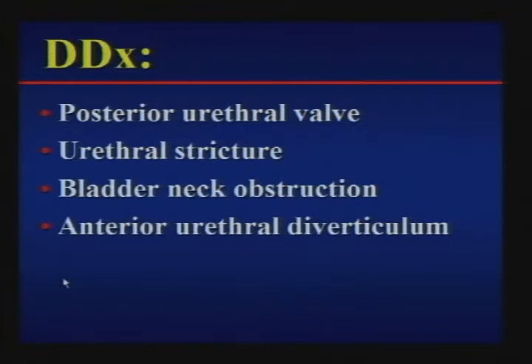What's on the differential? Well, hopefully they'll show you a nice example of posterior urethral valve. Urethral stricture doesn't usually occur in neonates. Bladder neck obstruction, anterior urethral diverticulum are possible, but they don't quite look the same. That's almost an Aunt Minnie. Okay, moving on.